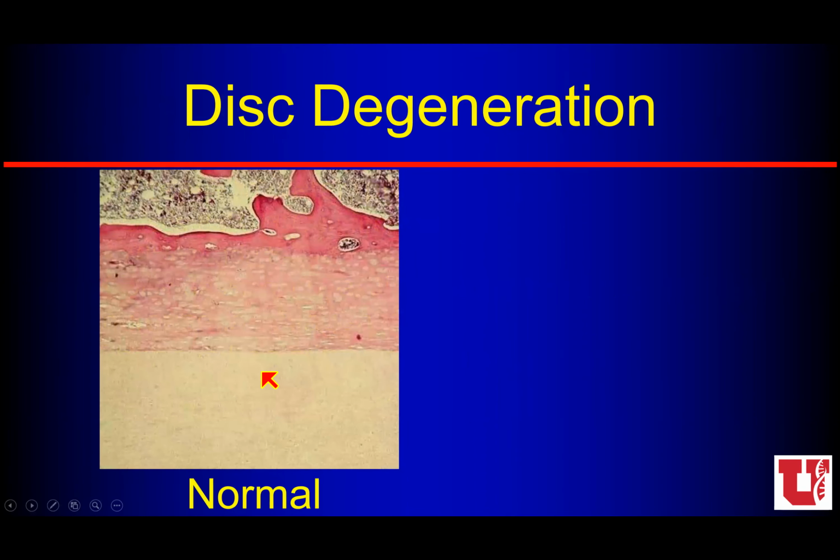So here's a pathology specimen we think about as a normal disc. Normally at the disc level, you have nucleus. So this is the nucleus on an H&E stain. Then we have a smooth cartilaginous junction. Then right here, a darker pink, that is the thin bone trabeculae. And then here you have normal hematopoietic marrow. So nucleus, smooth cartilaginous junction, thin bone trabeculae, and then normal hematopoietic marrow. That's what we think about as normal between the disc and the vertebral body itself.